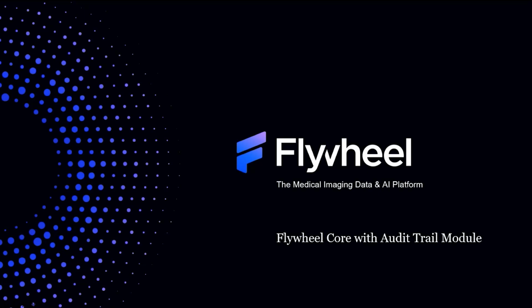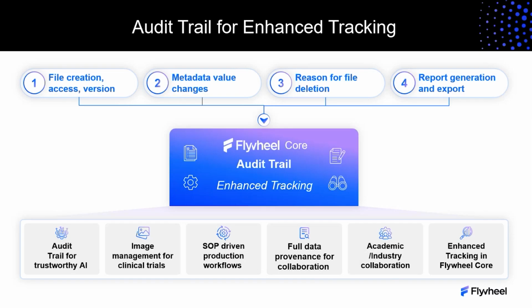This is Mike from Flywheel here to talk about the new Audit Trail module on Flywheel Core. The Audit Trail module will enable enhanced tracking of your data. In Flywheel, we do track provenance throughout, but this is very explicit tracking of file creation, access, and versioning, as well as changes to metadata and deletion reasons are added. All of this information is tracked, reported, and exportable into reports.